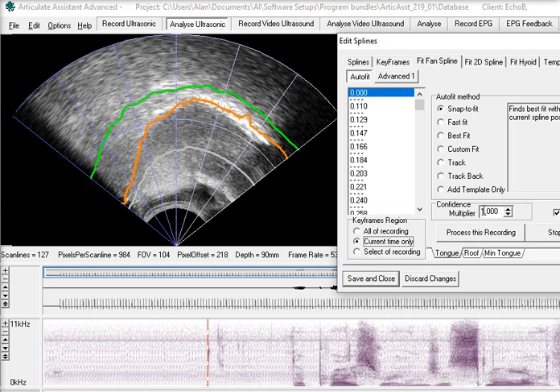We've got the confidence multiplier set to 1. You might want to set this a little bit higher. But at the moment, we can see it's sort of fading out where it's dark and it's solid where there's an edge. So that's a reasonable value at the moment. Now it's a little bit ragged. It's following the brightness contour, but it's not very smooth.